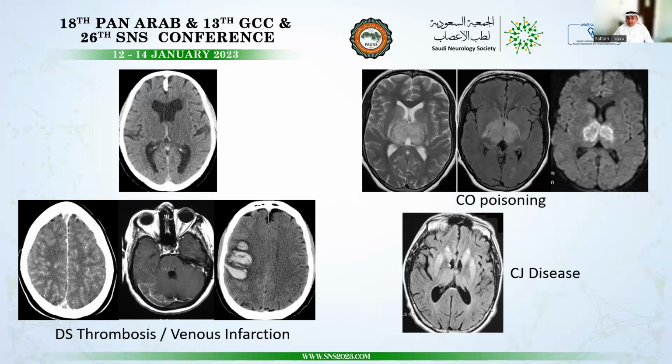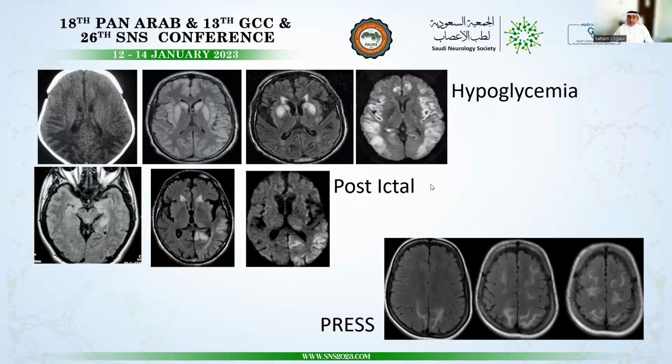However, the differentiation between the gray-white matter is preserved, and obviously the clinical scenario is completely different. Cortical ischemia with restricted diffusion along the cortices and the basal ganglia is often seen in case of hypoglycemia, post-ictal status, and in posterior reversible encephalopathy syndrome, such as cases of eclampsia and preeclampsia. However, these situations are usually reversible because they are transient. They recover gradually over 3 days. Repeat examination with proper treatment after 3 to 4 days may show regression of most of these findings.